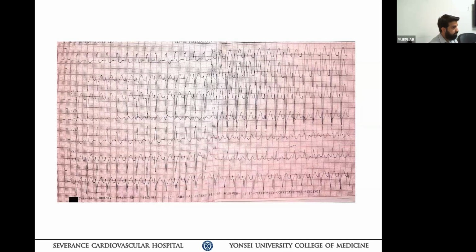I think this is SVT, because, as you said, the morphology is not appropriate for the morphology criteria.